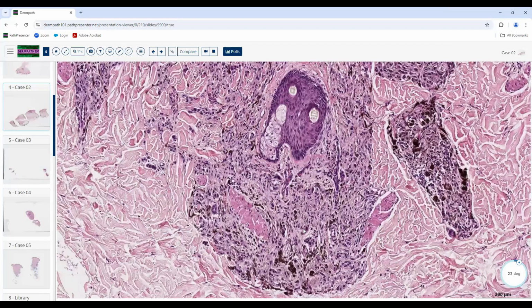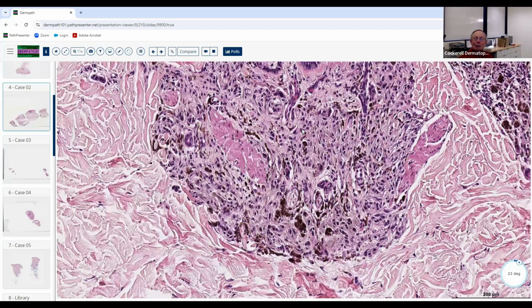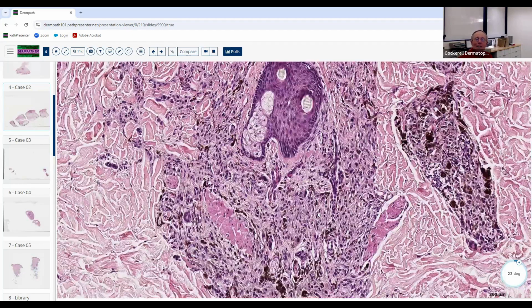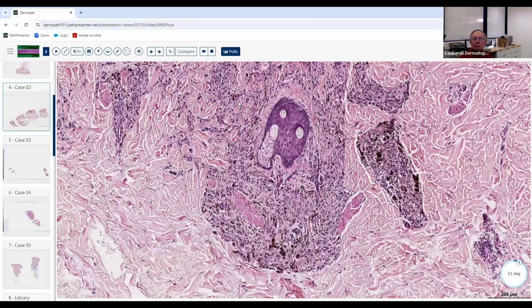There's a deep penetrating component to it. Basically correct, it's a deeper component. And so they said, wow, it's got this little clone that goes down more deeply, and the cells are large. If you take these cells and transplant them into a dysplastic nevus at the junction, they look the same, which is interesting. So it's almost like the cells of a dysplastic nevus have formed these nodular aggregations and just extend more deeply. And they're almost always associated with the overlying pattern of a congenital nevus.